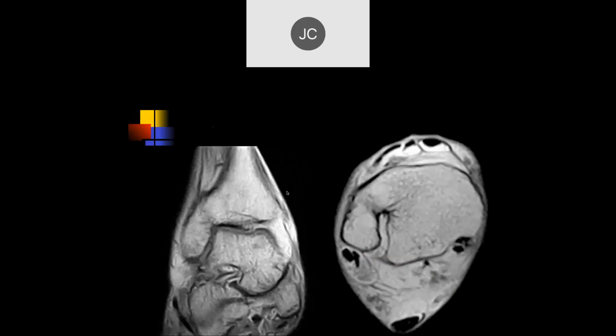Robert. All right, so here looking at the ankle. On the axial views, it looks like there's fusion of the talus and the lateral malleolus. And so fusions, they certainly can be congenital, but if they're acquired, it's very commonly seen in rheumatoid arthritis. And when we get to, well, let's see, we had the arthritis lecture. Did I show examples of how this happens yet? We'll certainly do it again when we do the wrist.